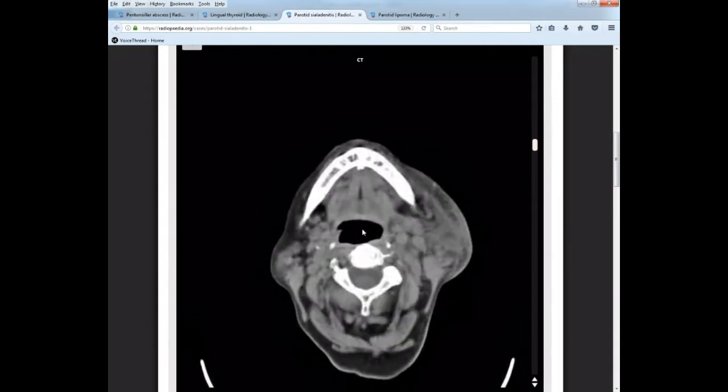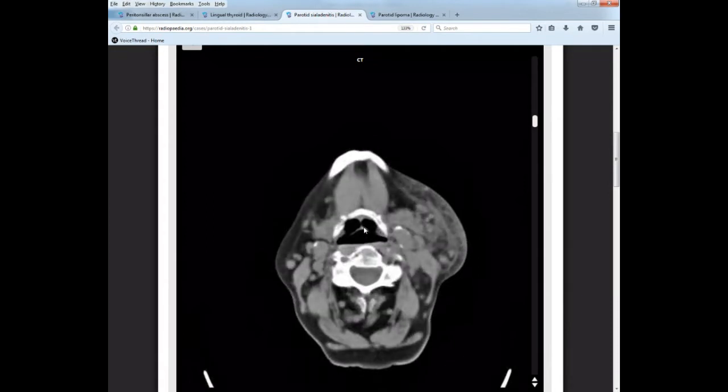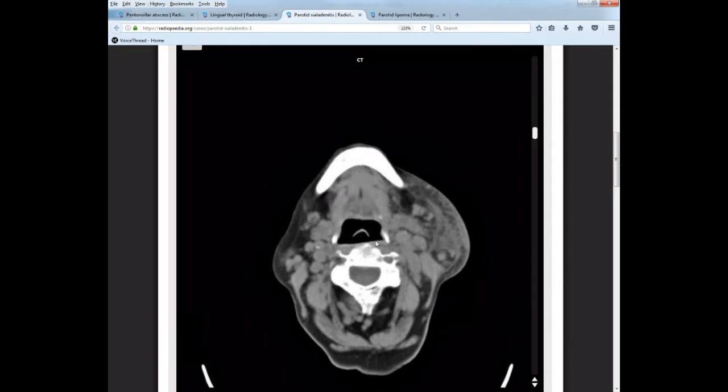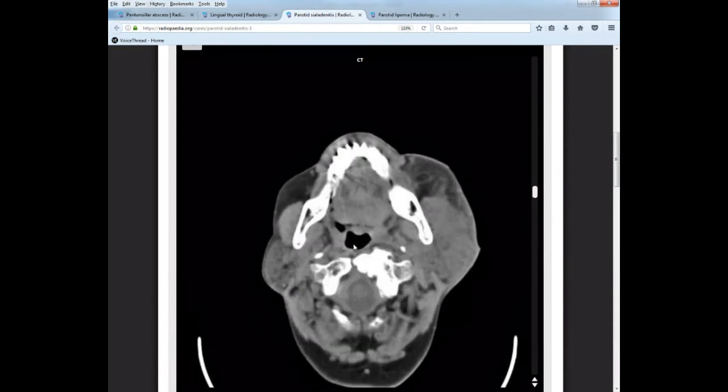The next thing we should be looking for is epiglottis. And here's your epiglottis right here. It's coming in. When you see the epiglottis, the two round pouch-like structures anterior to the epiglottis are your vallecula. Okay, they're anterior to the epiglottis. And as we continue down, we're going to now look posterior for our piriform sinuses. So epiglottis still here, coming down, coming down, coming down.